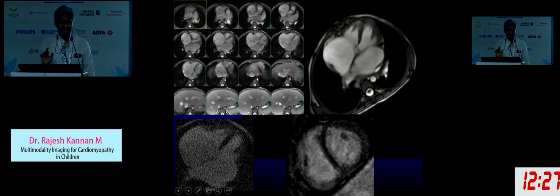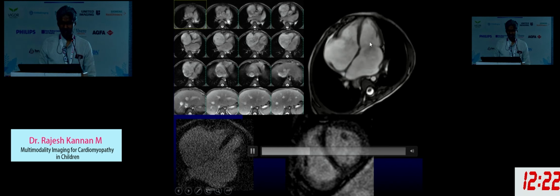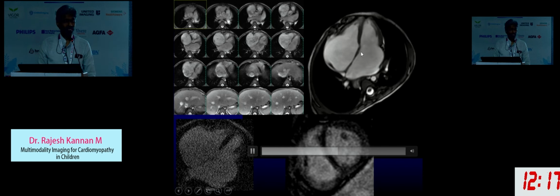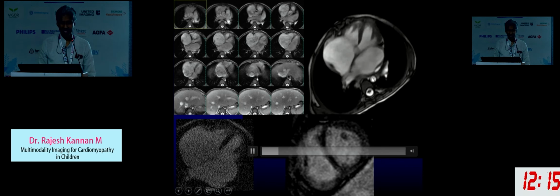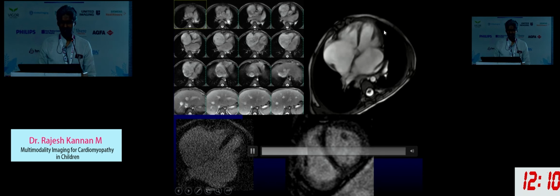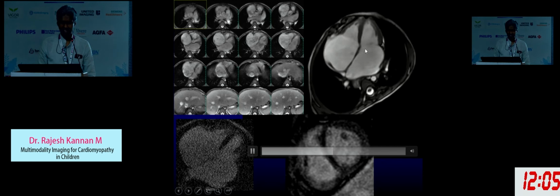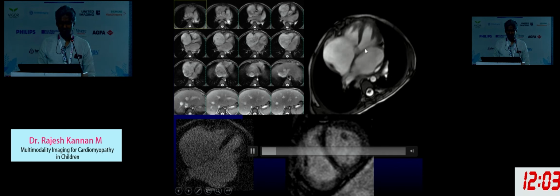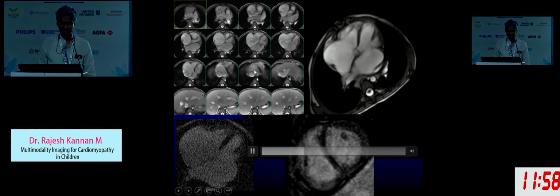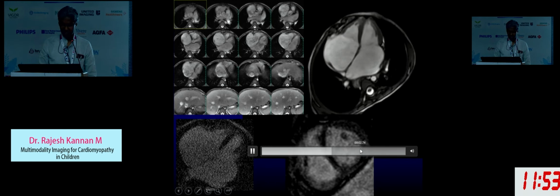So how will you diagnose or suspect restrictive cardiomyopathy? This is a typical pattern where you can see that the myocardial wall thickness is nearly normal, but look at the atria. The atria are disproportionately dilated, hugely dilated. Here again we can see that both the atria are really dilated. The ventricular systolic function is nearly normal, but if you do the mitral inflow PC, then you can see severe diastolic dysfunction, and also a dilated IVC and hepatic vein, and in this case there is no LGE.